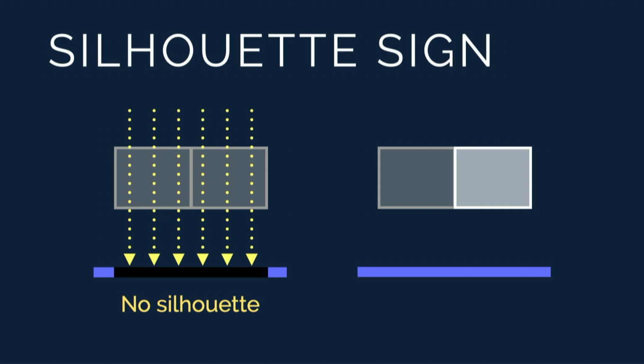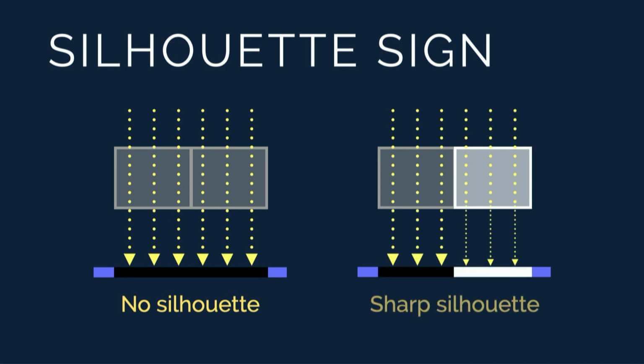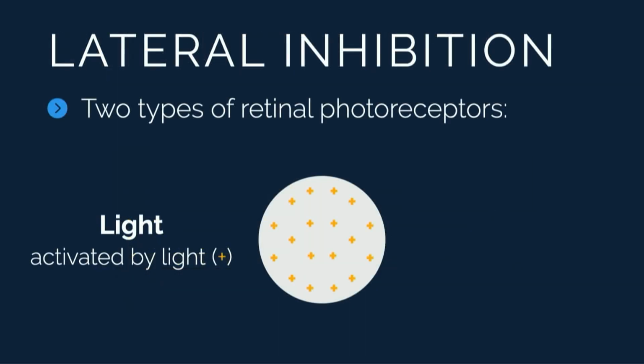Whereas if you have objects of different density and they're next to each other, the more dense structure will attenuate the x-rays more, and it will preserve the density as well as preserve the interface. And so then you can see that, hey, even though they're next to each other, the interface is preserved. And we use that to our advantage.